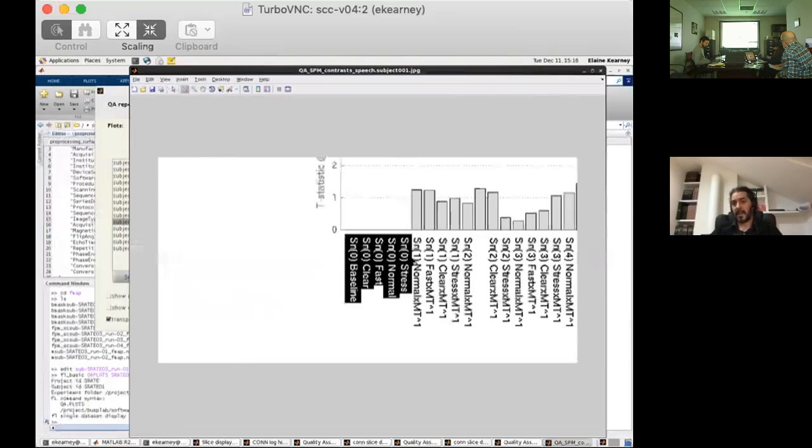If we have a run that suddenly moved a lot, then we're going to have a lot of outliers for that run, and anything in that run is going to be very difficult to evaluate because we don't have enough time points, degrees of freedom or anything like that. The typical approach in SPM is that anything you want to estimate, it estimates in a session-specific way, and then if you don't care about sessions, you just compute the average across all of the sessions. But that typical approach doesn't quite work when one particular session is awfully bad and all estimates are very bad, because then all of the estimates for that session get into the average in an equally weighted manner, and they add a lot of noise.